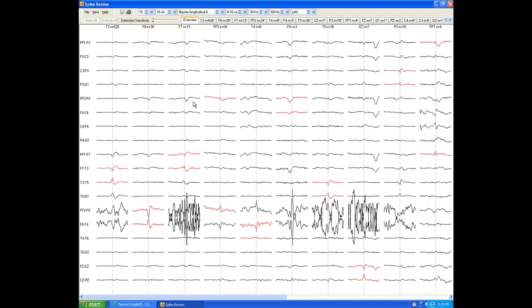Look at the other waveform averages to see if there are any other detections that appear to show a spike. There appears to be a phase reversal, a slow wave, and a field at the P3 group. So double-click on that average and we'll view the original non-averaged waveforms.